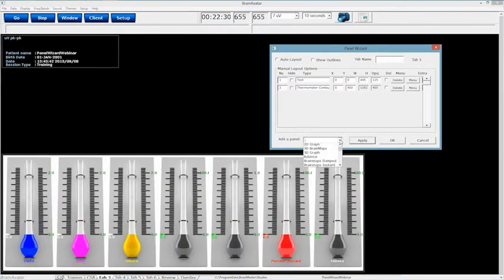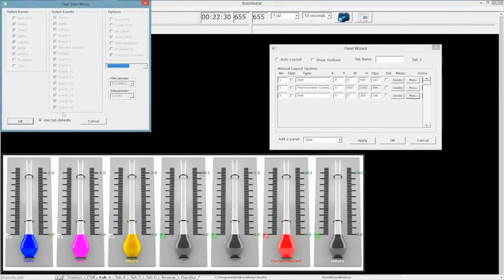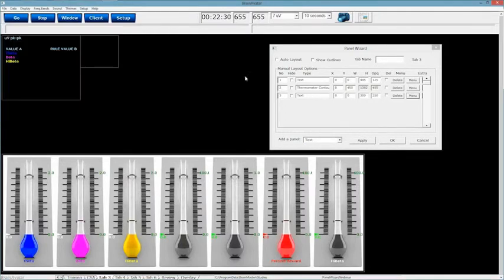All right. Now I'm going to bring in another text stat. Because on this text stat, I'm going to change the information that's being displayed. So I'm going to go to that menu, and I'm going to take off my tab defaults. And I'm going to uncheck everything except for my first three events, theta, beta, and high beta. I'm going to uncheck training channels. I'm going to hit OK.